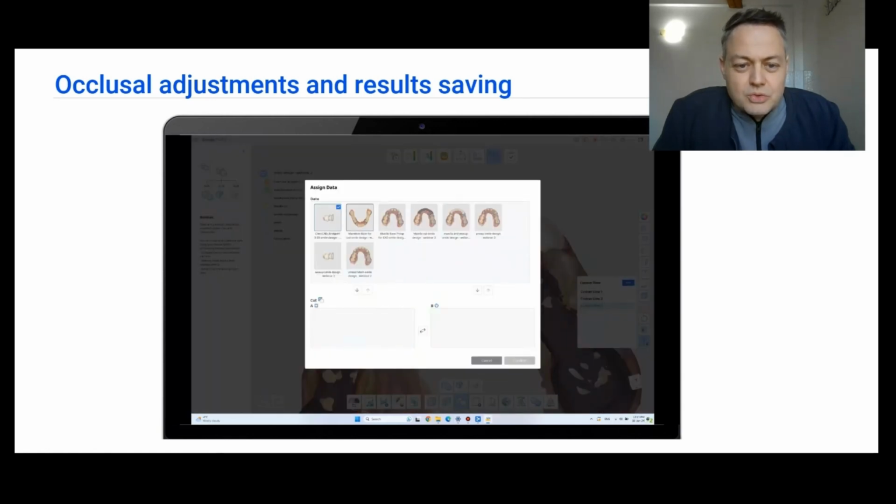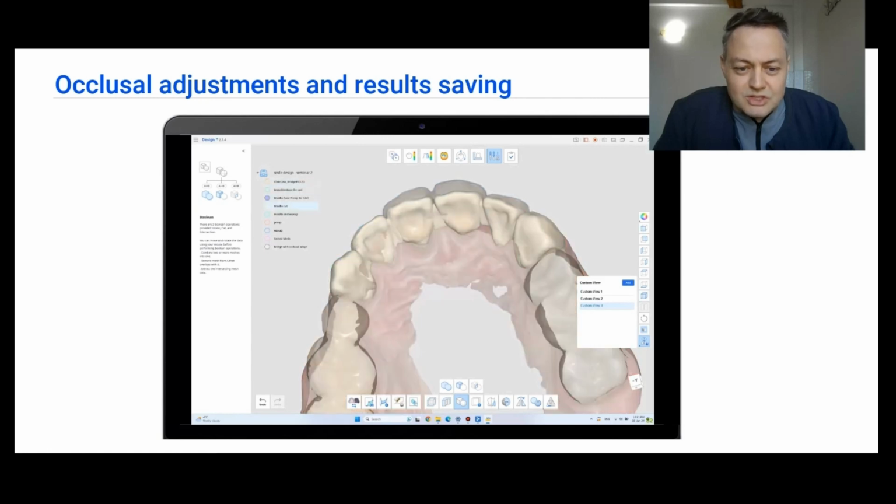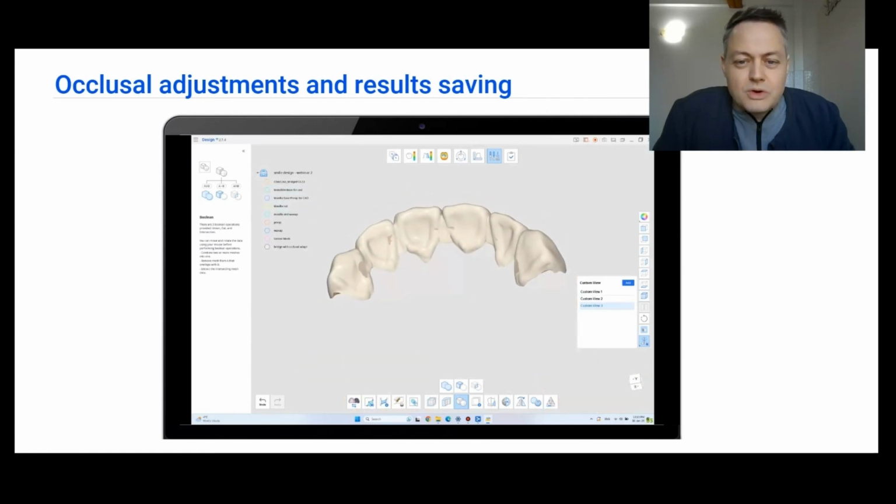We are just going to perform a Boolean cut, and the cut is done by the mandible cutting on the bridge, but not on the wax-up that has the bridge and the maxilla, because then it's going to also cut the interferences to the other teeth. We only want to cut the interferences on our bridge.